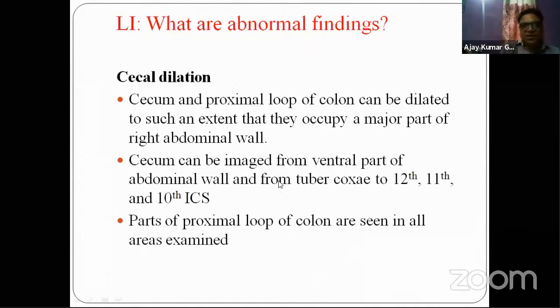In case of cecal dilatation, the only finding that you detect ultrasonographically is that the cecum and the proximal colon will occupy the entire right side of the abdomen. They will displace all other organs and occupy the right side of the abdomen.